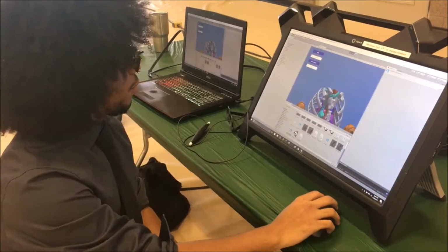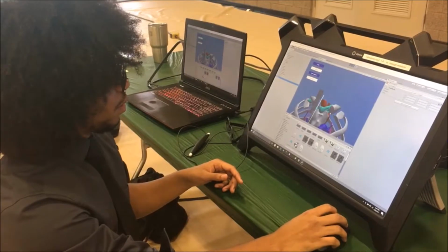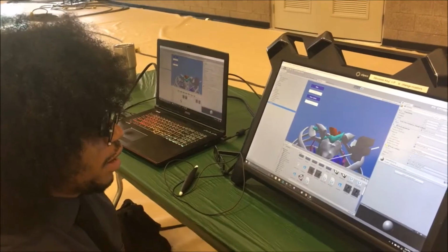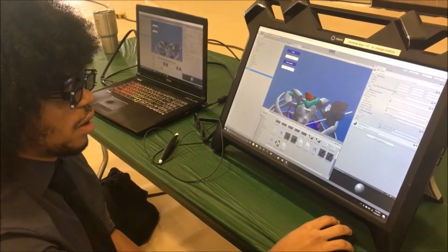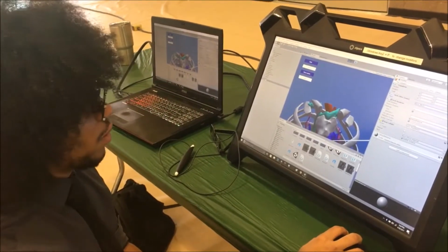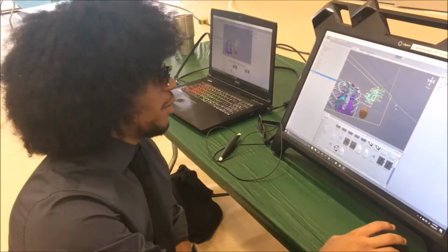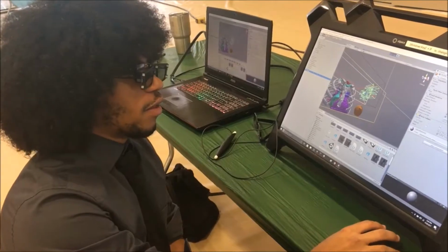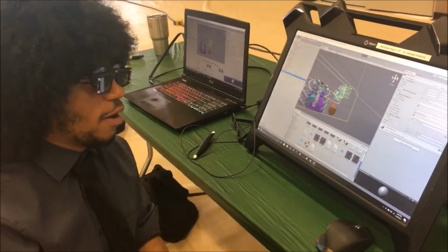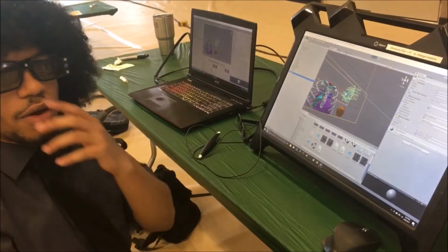However, if we pause the program and we go to the humanoid, we can see it has a Mesh Collider on it, and the way this works is in the scene we can see the Mesh Collider around the object. After inputting the OBJ we draw the vertices, and the Mesh Collider takes care of drawing lines for those vertices, and those lines act as a collision detection for the other objects in the scene.